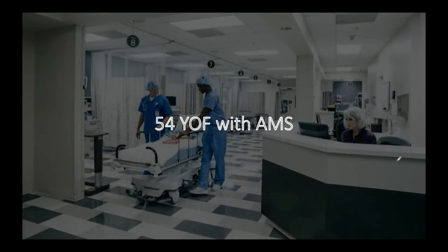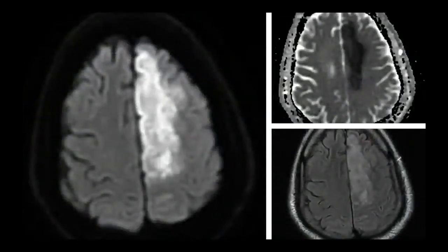So the next patient comes in. Of course, neurology residents are always busy in stroke. 54-year-old female with altered mental status. In this patient, anyone wants to take this one? Left ACA stroke. Left ACA. Do you want to call it acute, subacute, or chronic? What do you think it is? Maybe acute. Acute. Why am I saying it's acute?